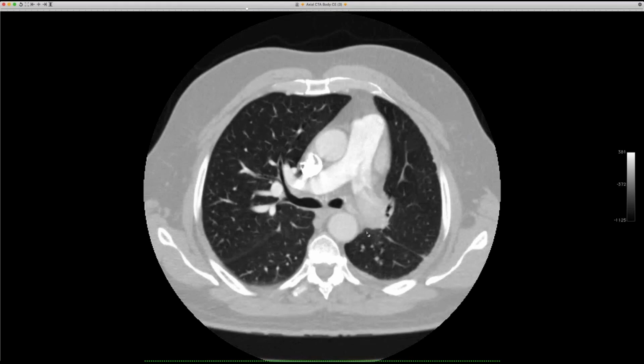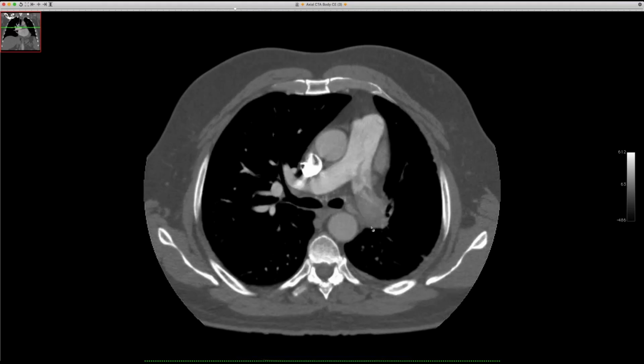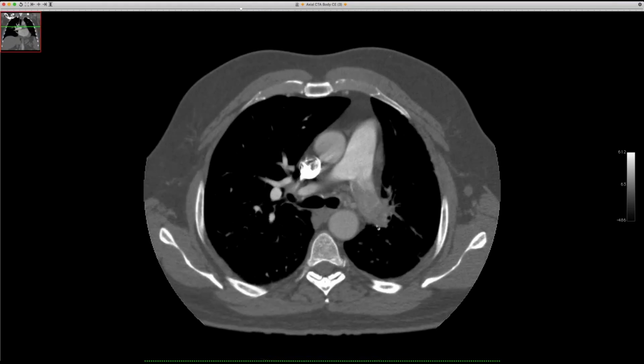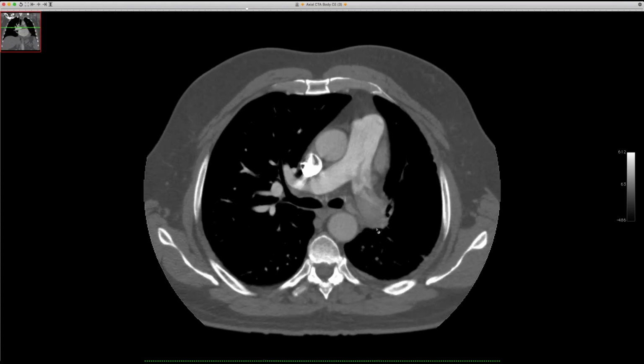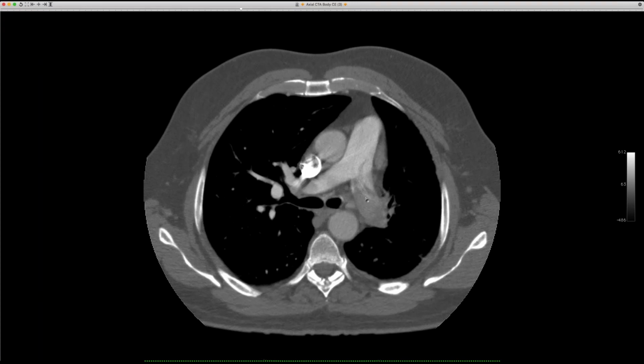Some patients may benefit from rituximab to try to at least halt any progression, but surgical intervention, short of putting a stent in here or there, is usually fraught with lots of badness. But I like the smoke in particular. I thought it was pretty nice in this case. Yeah, very impressive. Okay.